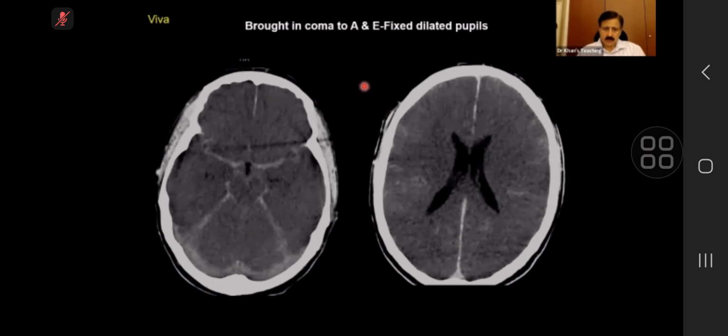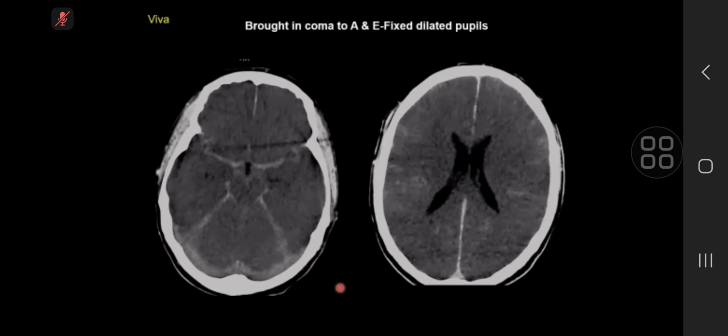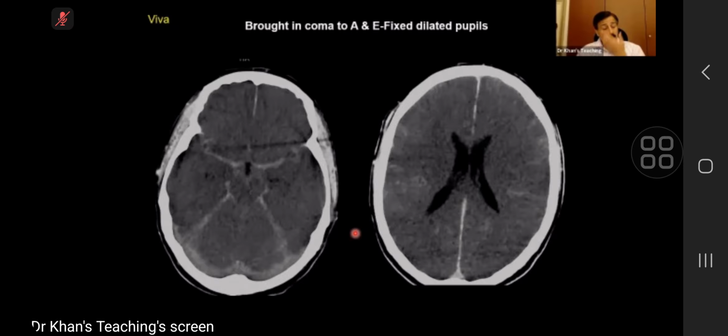Okay. Over to you. These are non-contrast axial images of the CT head. There is diffuse loss of gray white matter differentiation throughout with the pseudo-subarachnoid sign due to diffuse cerebral edema. This is in keeping with hypoxic ischemic injury. Excellent. So you see, this type of case has come in the exam many a time, and the key is that there is loss of gray white matter differentiation.